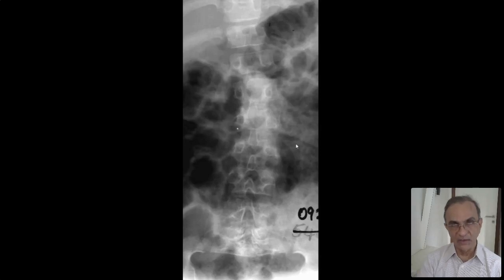But when you have a patient with a skeletal dysplasia and you look at the lumbar spine and you find that this doesn't happen, this rule is not followed. So the rule is broken. So when the rule is broken, what happens? The L4 interpedicular distance is not the widest interpedicular distance. Close your eyes and say this is achondroplasia. No other scale. See, I'm making it easy for you.